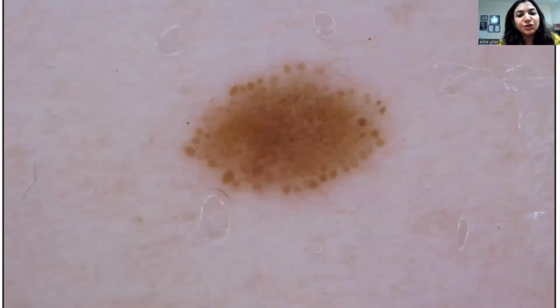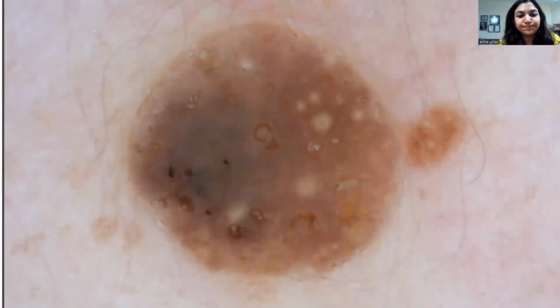And then a benign lesion, obviously, benign. What is it? This elephant should instantly tell you that it's an SK, it's a seborrheic keratosis. Very much well-defined lesion. Look at the periphery. It's pretty much well-defined lesion with milia-like cysts and comedo-like openings, okay? अगर ये milia-like cysts और comedo-like openings हैं and the lesion is very much well defined, even this much of grayish area is tolerable.